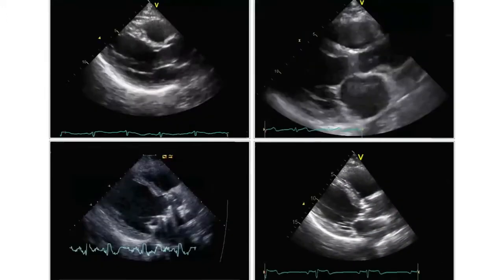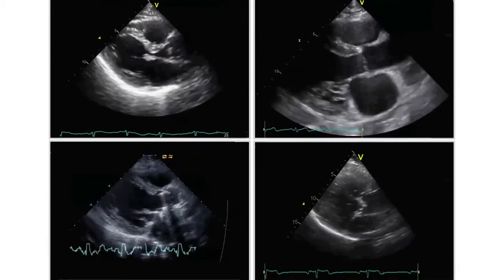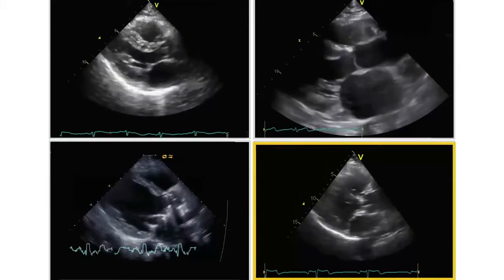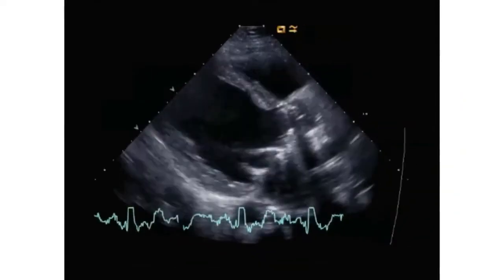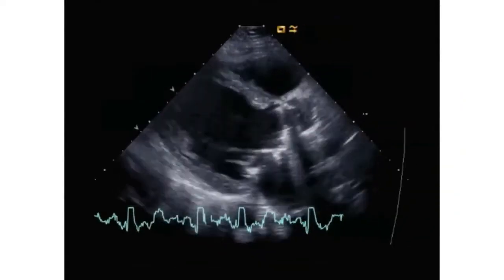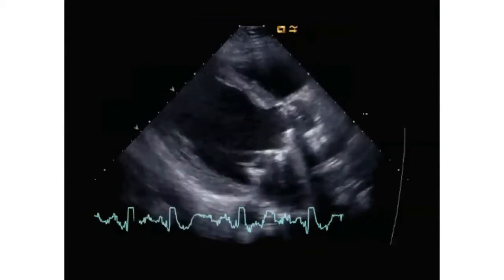Of course, the valve which was stenotic is the last one. But Anna, couldn't it also have been the one here? Doesn't that also look like an aortic stenosis? I mean, there are a lot of echoes there. It looks calcified. Yes, Thomas, but what you are seeing is actually something else. They are prostheses and rings. We will talk about them later on in our course, so don't worry for now.